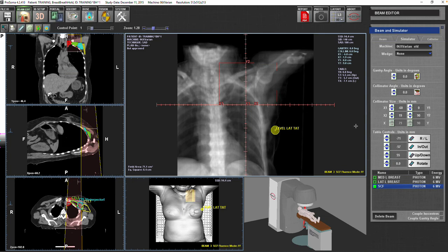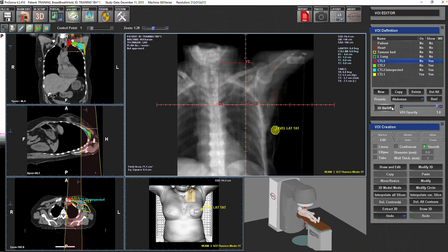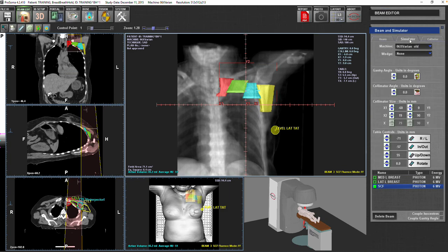So this would be your field, or if you don't want to take level 2. Sometimes, which is very good for me, and I like that so much, when I open this, let's say I want to take level 2 properly because my surgeon didn't touch it, for example. So if I put my level 2 here, you can see it's cut. So this, I will leave it for you, meaning that if you think that your surgeon didn't touch level 2, which sometimes is the case, and you want to cover level 2 properly, which here will be the blue color, then all you have to do is push your lateral border more.